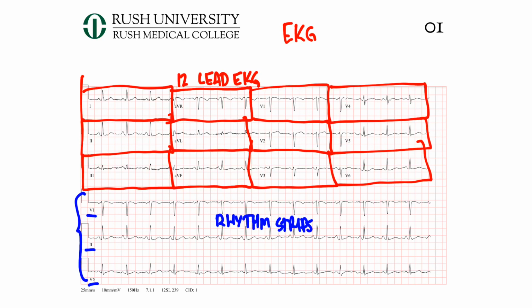Now, for this course, for the self-study, I've given you 3 EKGs, and for the in-class portion, you have, I think, about 9 or 10 of them. And on a normal EKG, up here at the top, you're going to see a whole bunch of information that calculates the rate, the rhythm, the axis, all of that for you. But where's the fun in that? We're going to do it ourselves instead of letting the computer do it.